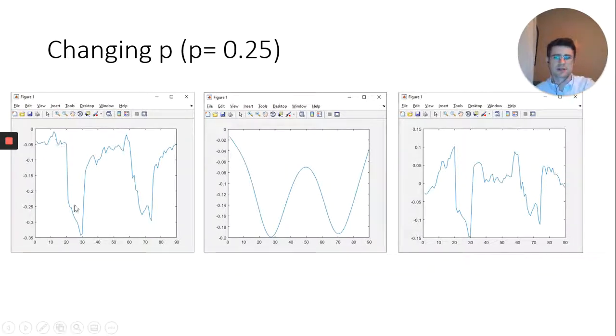So here you can see my original data. Here's my model, and you see it actually kind of fits the data right there. But then the output is still kind of motiony. I would say there's still 2 pretty significant cuts right there that don't look too trustworthy. It's a little better than before, but I wouldn't say much better.